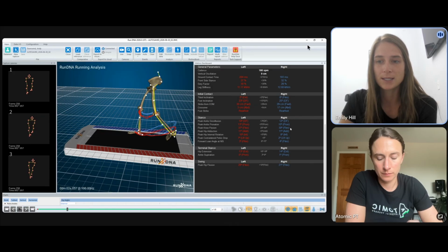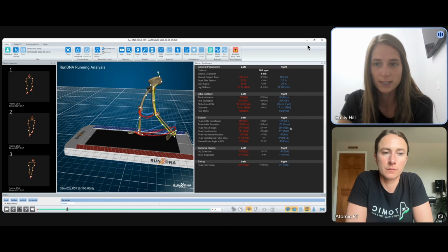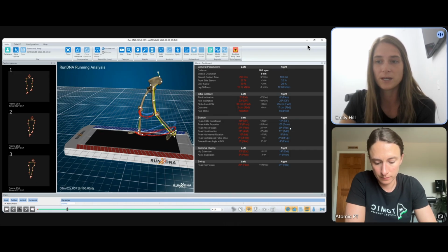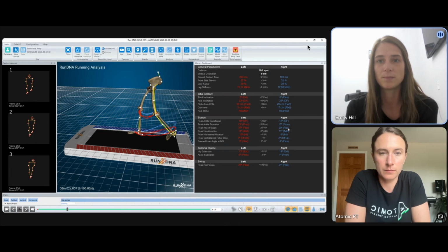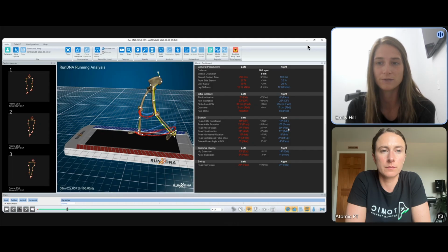And then knowing that he has that chronic knee injury on the right, this makes sense because he's not going to be wanting to load that quad as much, because when he loads that quad a lot, he gets more stress put through that patellar tendon, and that increases some of his runner's knee symptoms. So I am not surprised by seeing this number be lower on the right, but it's definitely something we want to keep note of because it'd be something that we want to address because we don't want the body compensating, trying not to load that quad, whether it's because of an increase in pain symptoms or it's just a fear mechanism of him kind of getting used to not loading that quad after going through this injury. But definitely something to take note of and something that we probably want to try and increase as we work with Andy.